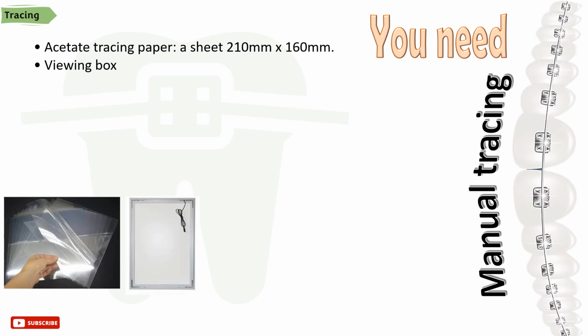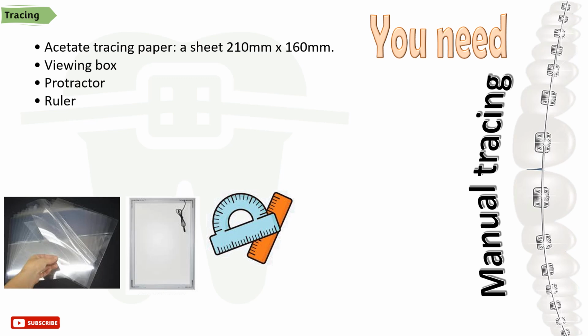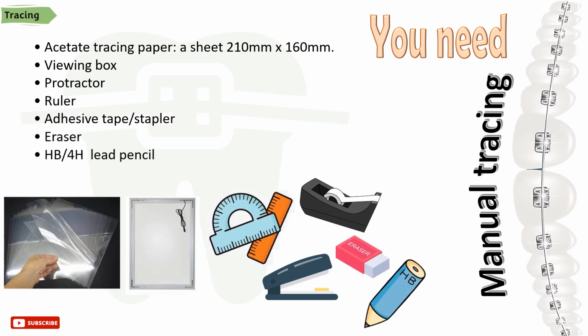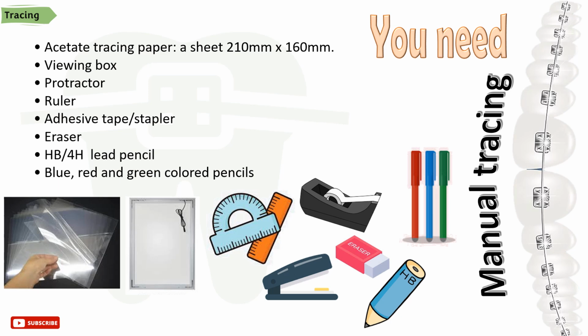A protractor to measure the angles. A ruler to measure the lengths. Adhesive tape or stapler to attach the acetate paper to the film so it doesn't move. An eraser, an HB or 4H lead pencil, and colored pencils to mark different points or landmarks.